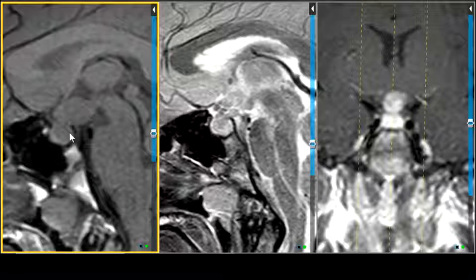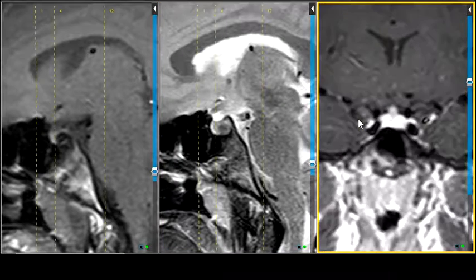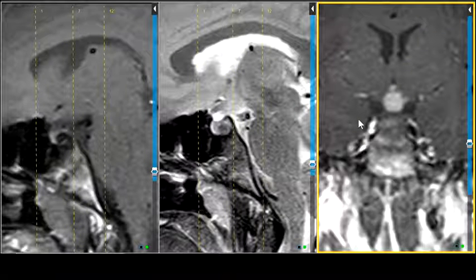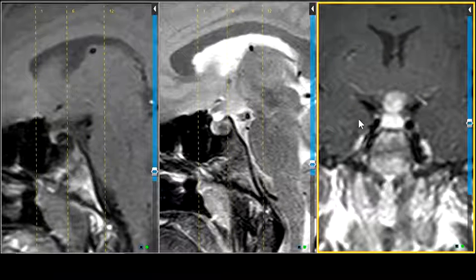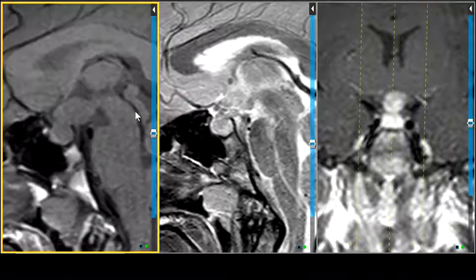Now, I would say from the surgical standpoint, nobody is going to like that idea very much. Nobody wants to dig into anyone's hypothalamus. So we're going to really go to lengths to try to make a diagnosis, including CSF studies, and just really correlating all the other things that we can in terms of age and whether there are other findings elsewhere in the brain that would help us. So I think that's kind of our differential, lymphoma maybe, but given the age, I would say germinoma is going to be up there. And I think the person that read it favored germinoma and eosinophilic granuloma.